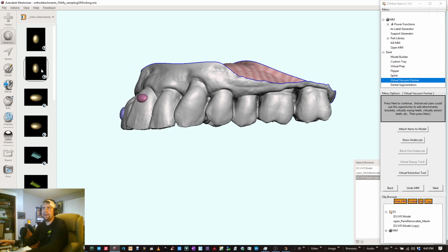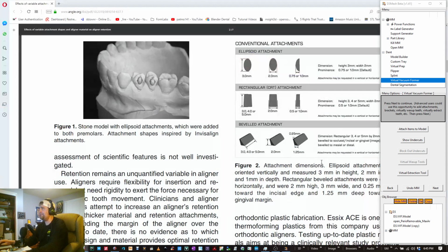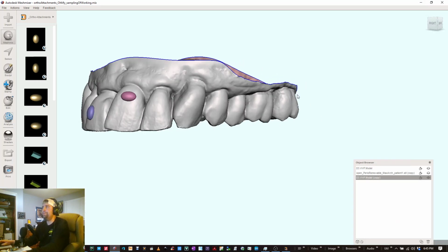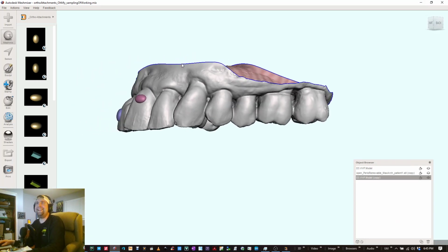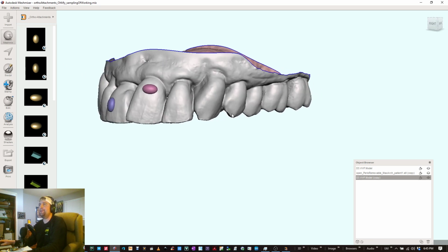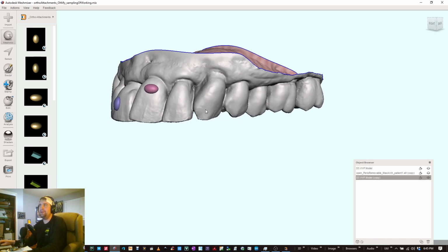Okay, the different kinds I have here are... I guess I called it Ovoid in the title. Let me go back here, but I think it's called Ellipsoid. Yeah, it is. Shoot. Well, there you go. My bad. It's definitely called Ellipsoid. But for whatever reason, I chose Ovoid for the title. Either way, same thing. You know what I'm getting at.